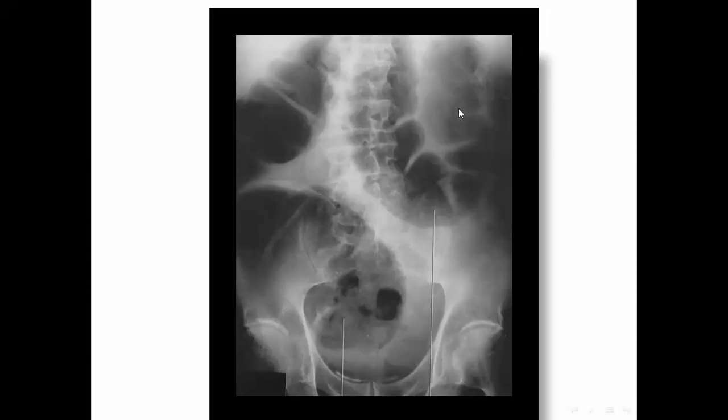This is a transverse colon, and here it is reaching into the pelvis. That's called redundant colon or dolichocolon, and this is the cecum reaching into the pelvis, and this may raise abnormal symptoms if there is appendicitis or something like that. This is an appearance which is non-specific, could be due to constipation.